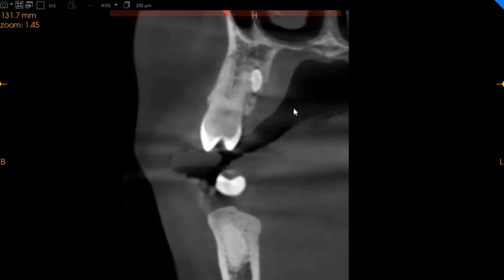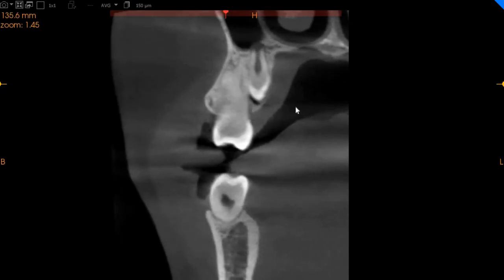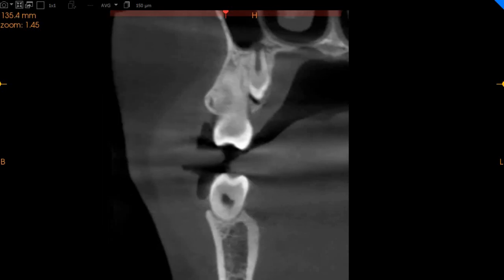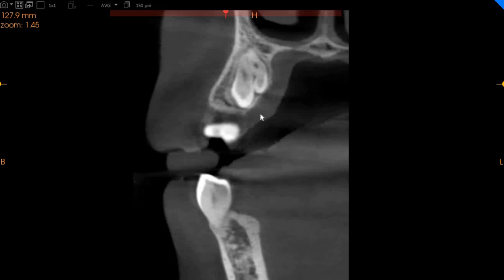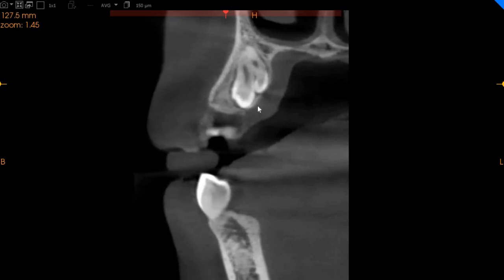Now from the appearance, as you can very clearly see, there's one also right here close to the upper left 5, and you've got a tooth-like structure extending on the palatal surface. All of these lesions are apical and palatal, but predominantly palatal in every case. Now from the anatomy, even though there is no histology that we can confirm, our differential diagnosis is that this could be a compound odontoma, as their appearance can very clearly identify.